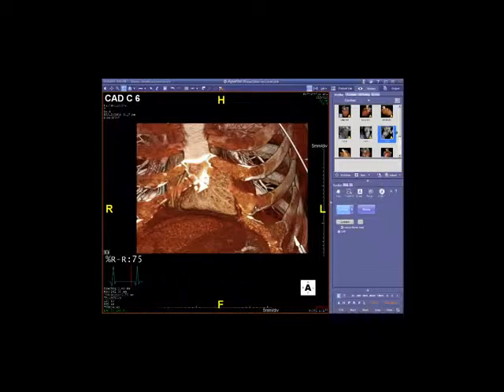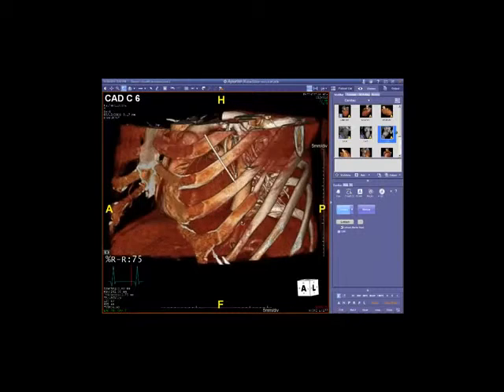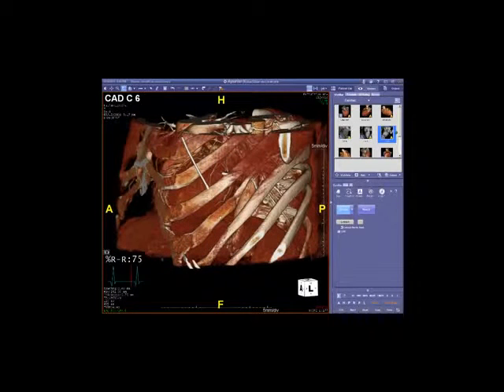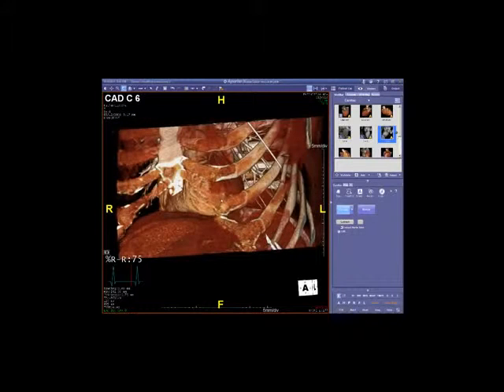This first case is a 64-year-old male who has a history of a prior thoracotomy due to a lung mass that turned out to be valley fever. He lives here in Arizona, and on the 3D visualization you can actually see that there's some deformity here of his rib, where it's thinned out, where they had accessed the lateral chest wall.